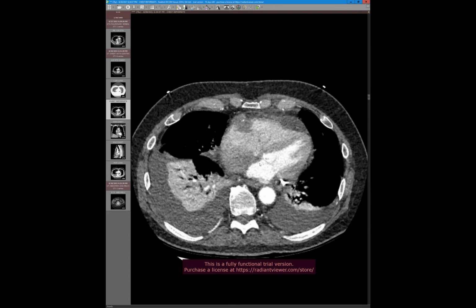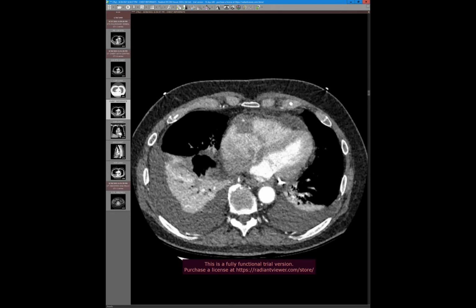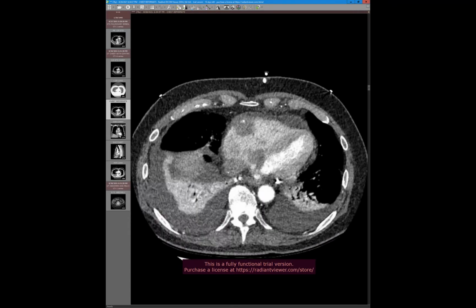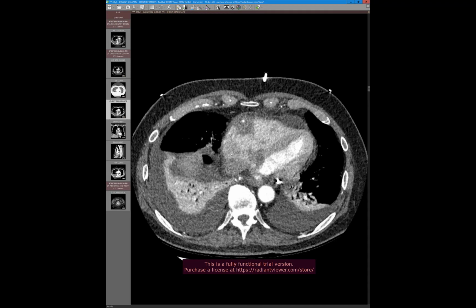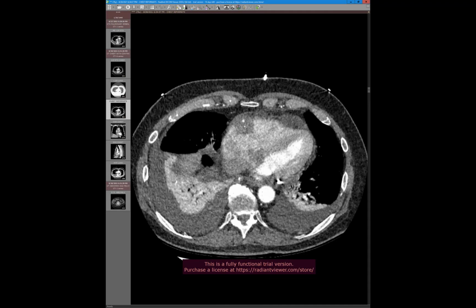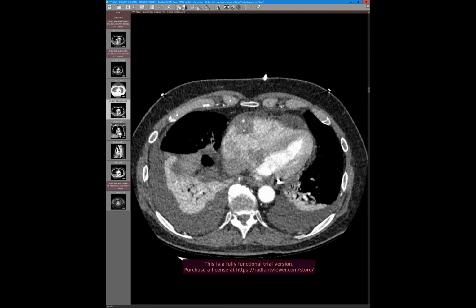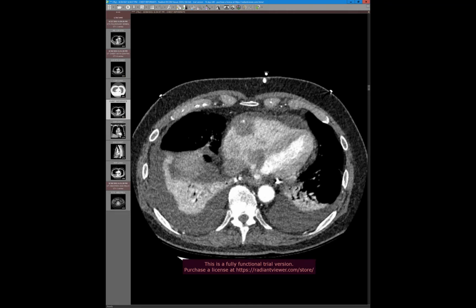I mean, I have to go back and check. Especially on the collaterals, right? The collaterals are really impressive, and there aren't many. Although it's not a gated study, there aren't many here. But that's another good point. I don't know if I've seen it. I mean, it makes sense it would be dilated, but usually they're so infiltrative around the RCA. I wonder if the compression of the tumor itself may prevent that from happening to some degree. I don't know. I haven't seen that, but it may happen. Yeah. But yeah, the angiosarcomas often have big feeding vessels coming from various lesions.